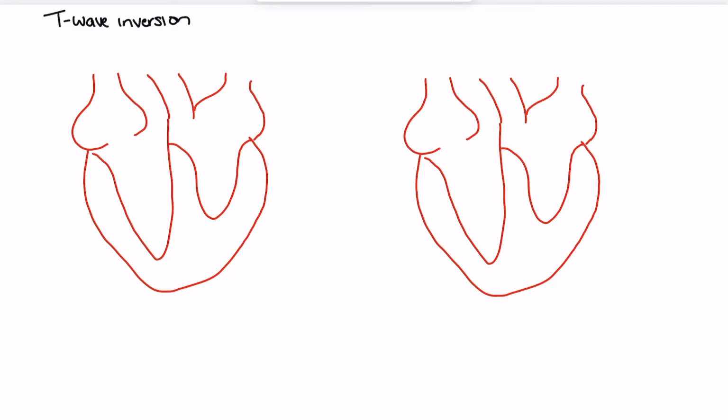So there are a number of pathological and non-pathological causes of T-wave inversion. Here, we are specifically talking about the potential for cardiac ischemia to cause these inversions. To understand that, we're first going to talk about the normal ECG and how this relates to depolarization and repolarization of the heart. For the most part in this video, we're going to be talking about the T wave. So our primary focus here is going to be on the T wave.